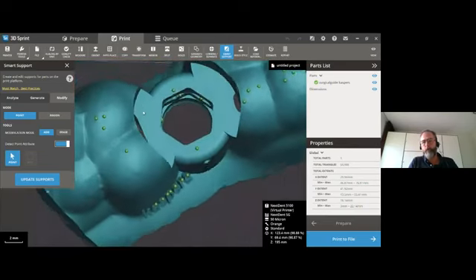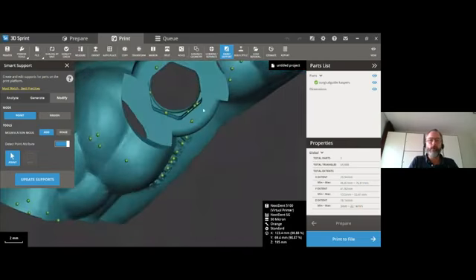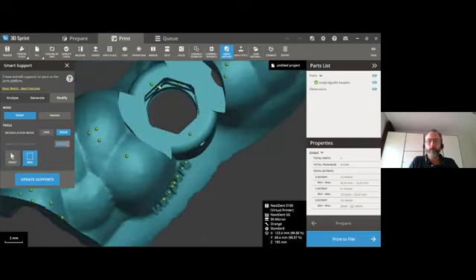So this is something that you have to be aware of, especially with surgical guides. That's why I'm showing you this. So you have to get rid of these supports inside. Now remember, erasing is not the best option. So what we are erasing here, we are going to add along the side here. So first I'm going to select, and that's also an option that we have. It's a box where we can get rid of some supports at the same time.